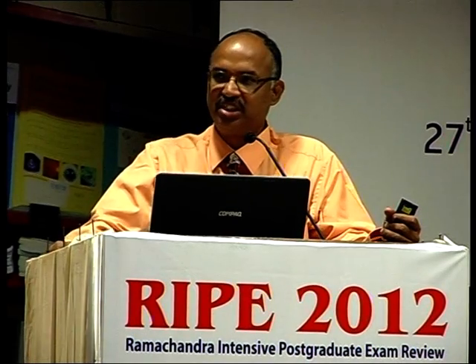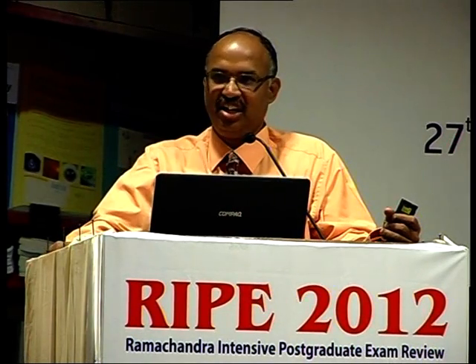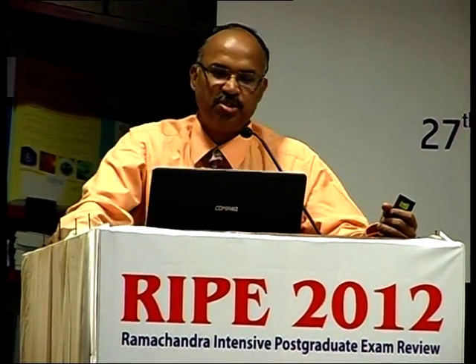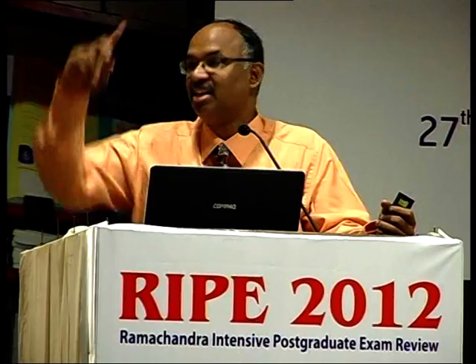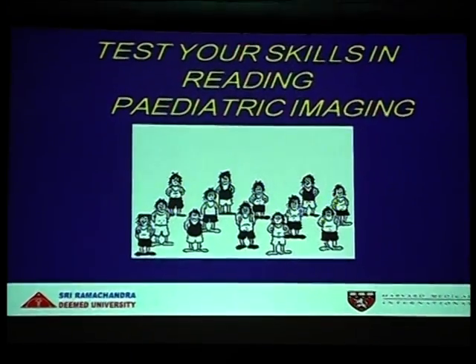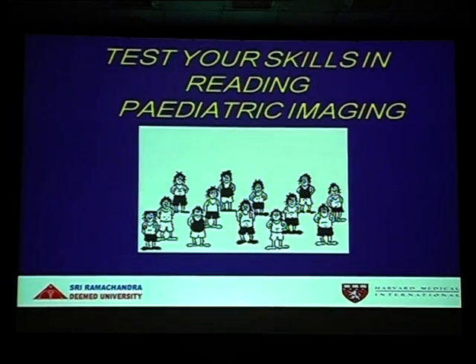Because it is a post-lunch session, I thought I will stimulate your brain cells by asking some questions regarding what I'm going to project. This is just to test your skills in reading pediatric imaging. It will be a juggling like this, but the diagnosis will be the one only in pediatric imaging.